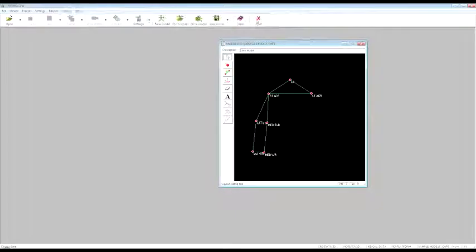So the next step is to switch over to the Smart Analyzer application to start processing the data that comes from the acquisition. Now you should see the Smart Analyzer application.